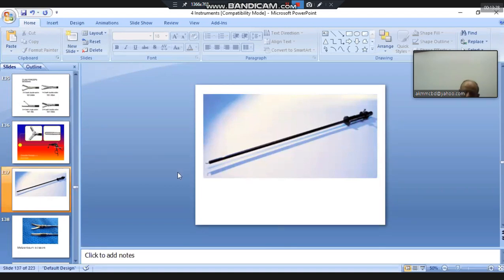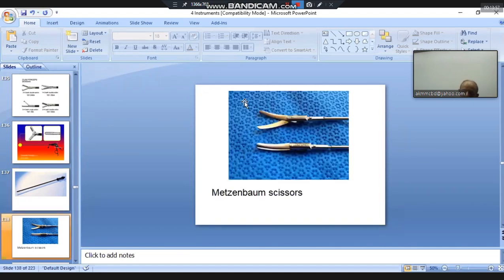And you see this blade. There is just a tube at the end, and there is a hole in the tube. There is nothing other than that. This is the sucker. Therefore, the end is blind and there is a hole in the end. That is the sucker, the laparoscopic sucker. And obviously, you know this instrument. This is scissor, the laparoscopic scissor.